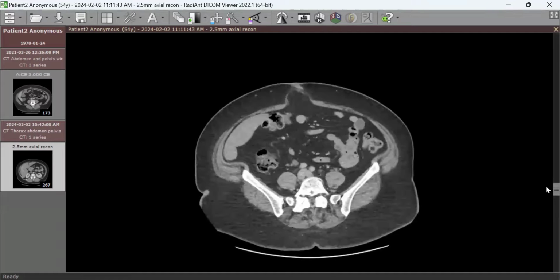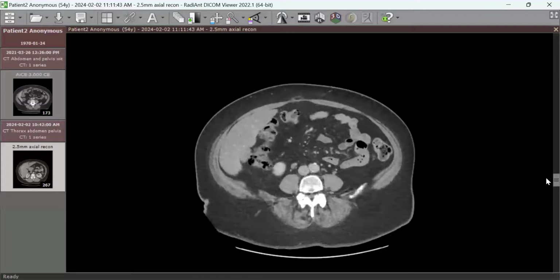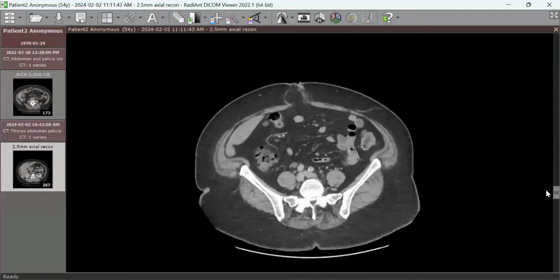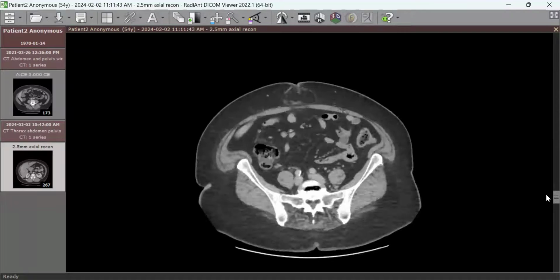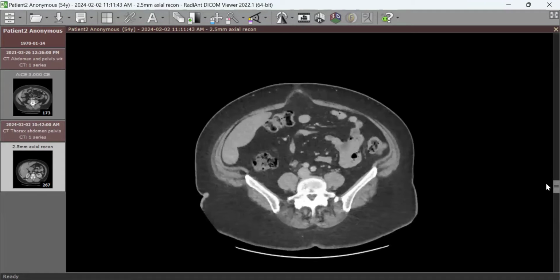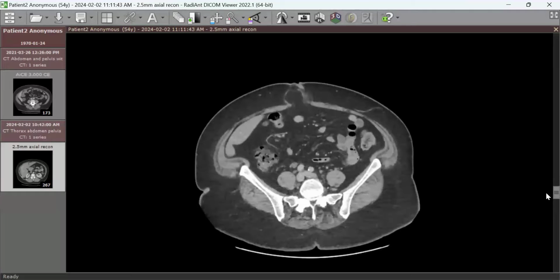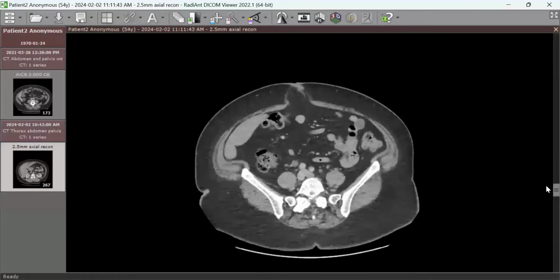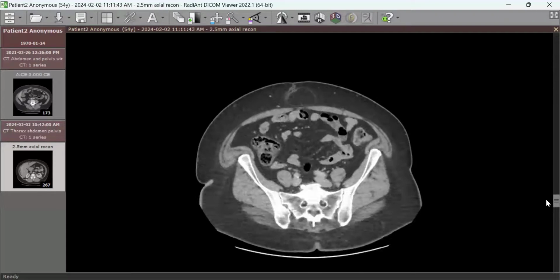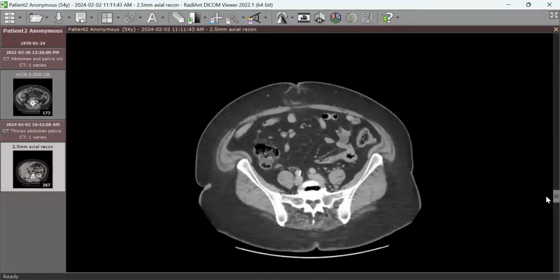So what's the description, diagnosis of this lesion here? Umbilical hernia. Yeah, it is umbilical hernia containing omental fat. Does it contain any bowel? There is no bowel, no fat stranding. Exactly. This is very important. If there's bowel, there's incarceration, strangulation. That's definitely important. But here we can see only fat, and even the fat itself, there is not much fluid in it or signs of inflammation or anything. So that's an umbilical hernia.